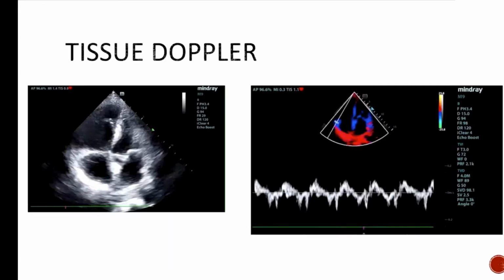All right. The next thing we're going to move on to is something called tissue Doppler. Now, we spoke about this 4 weeks ago, right? And tissue Doppler, as we discussed earlier, is a computer programming system within the machine itself that cancels out fast-moving, loud noise movement like blood velocity in Doppler, and it just looks at slower velocities. And you can use it to assess the velocity of actual myocardium moving upwards and downwards.